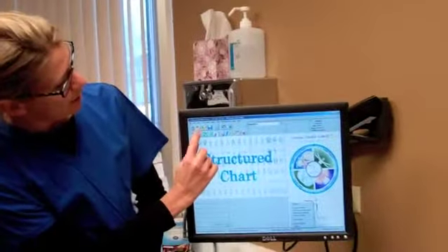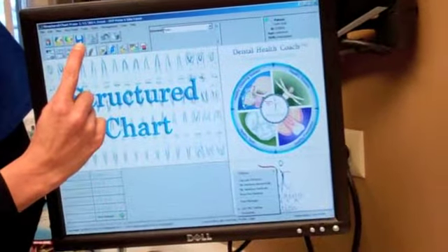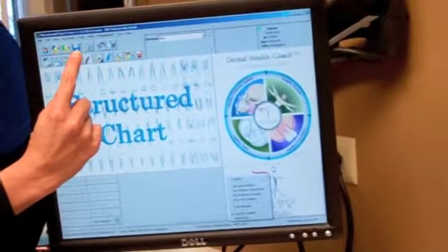If you go to the graph that we print out for the patient and the numbers are 0 or do not look quite right, that probably means that you did not save it. We didn't show you, but there is an icon on the computer that is also save. That would be the 4th from the left. So you can just click that and it will save it if you forgot to say save on the voice activation. And then that will bring the numbers on the graph up to date.